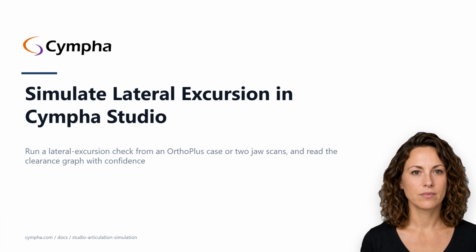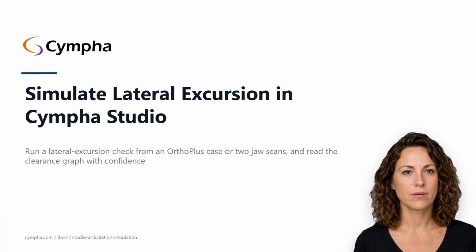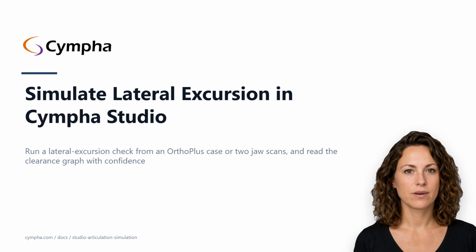By the end you'll know how to start an articulation session two different ways, from a loaded Ortho Plus case, or from two standalone jaw scans, how to position the occlusal reference plane, how to set the lateral limit and scrub the simulation, and how to read the clearance and collision graph at a high level.